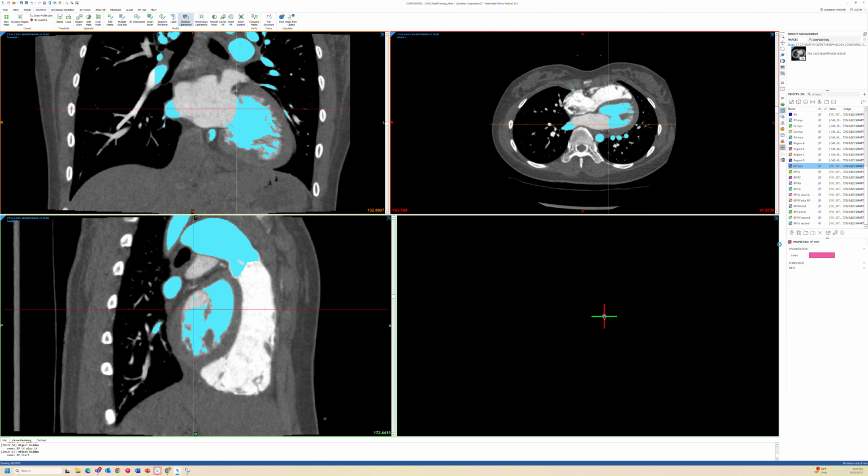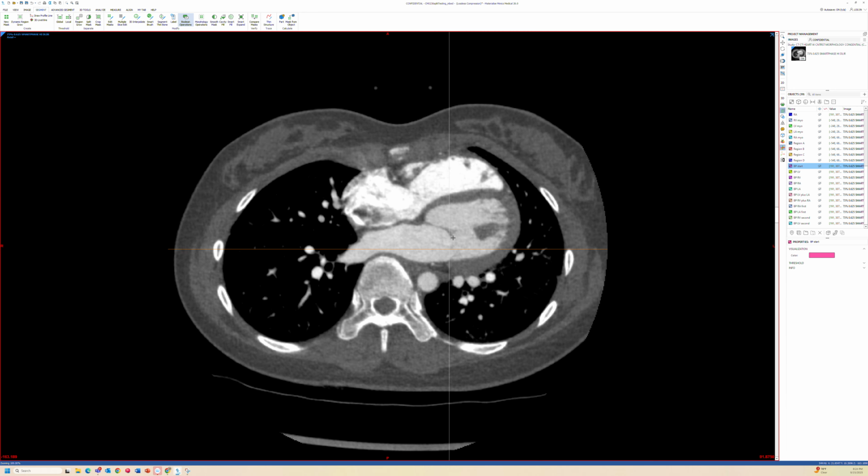is that if I zoom in here, you can see there's this concave nature. In other words, the left atrium, if this is the annular line here, the left atrium extends down in. When you think about it, whenever the heart is squeezing and these papillary muscles are holding the mitral valve, it's called prolapse if it comes up above the line. So the natural state is going to be a concave nature here.